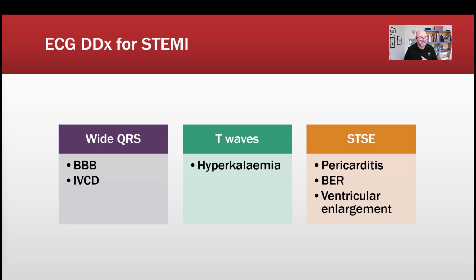position or its elevation. So when analysing wide QRS complexes, assume that the ST segment elevation is a STEMI mimic. It's essential to consider the QRS width before analysing the ST segment, as those secondary changes associated with the wider QRSs render the usual ST analysis method ineffective.